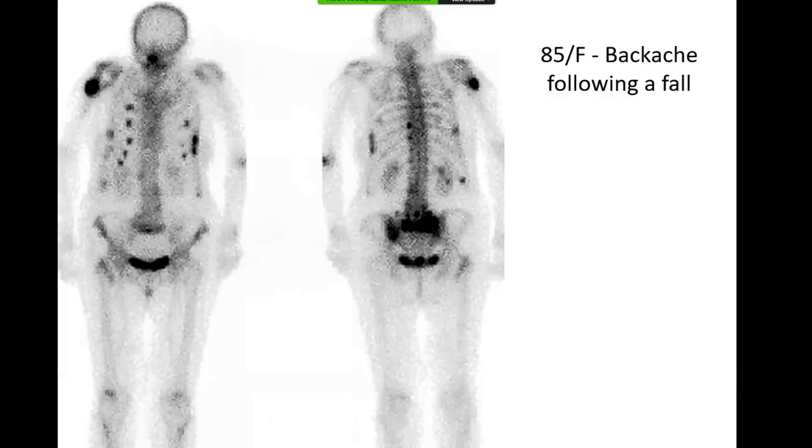Okay, good. What I'm trying to emphasize in this study is that even when you see multiple focal areas of increased uptake on a bone scan, they remain at best a non-specific finding, because fractures can also give rise to multiple areas of increased uptake, like metastasis or any other pathology of the bone. Any skeletal abnormality on a bone scan would give rise to increased uptake, or if there are multiple abnormalities, it would give rise to multiple increased uptake.